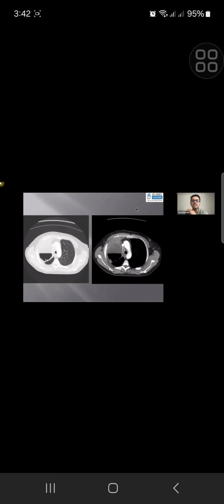It's defying gravity, no? What is the dependent aspect? So I am thinking if this CT was done in a different position, that has caused the gas. So try to look for CTs in different positions.